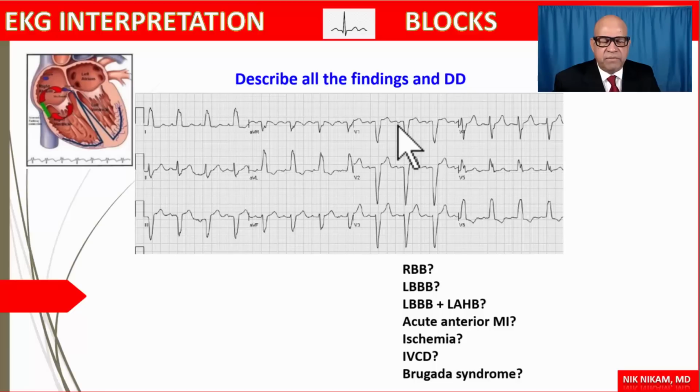Next, we also have left atrial enlargement. We also have ST elevation in the anterior leads, which is a common finding in patients with left bundle branch block. Also notice the deep S waves, which reflect the activation of the left side through the myocardial tissue. Next, we see there is ST depression and T wave inversion. These are discordant to the direction of the QRS complexes. This is an exceedingly important point that we have to mention when we are interpreting electrocardiograms in a setting of cardiology boards.